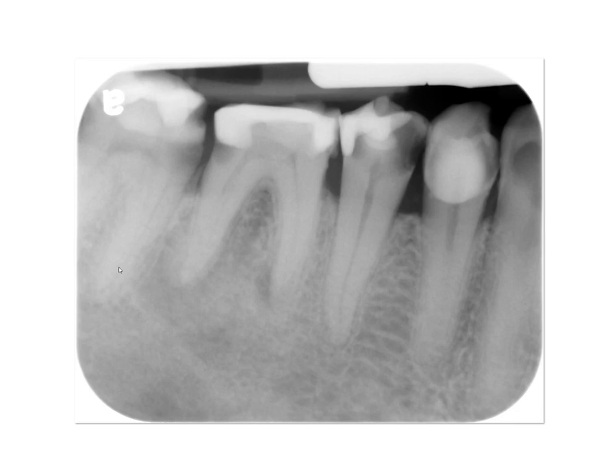Let's see, so alveolar crest, and this area is so radiopaque. I think it's really difficult to tell what's what, but this oblique radiopaque line most likely represents the internal oblique ridge.